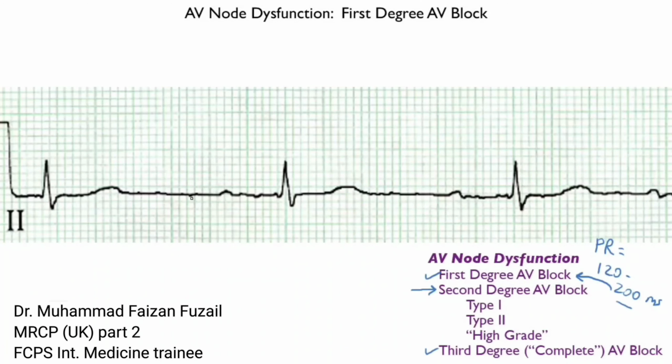We have this ECG here, and you can see it is fairly regular. The QRS look pretty wide apart. If you count the rate, here's one that lands on a heavy line: 300, 150, 100, 75, 60. So we're talking about 50 beats per minute. When we look for P waves, we do see that there is a P wave in front of every QRS complex.